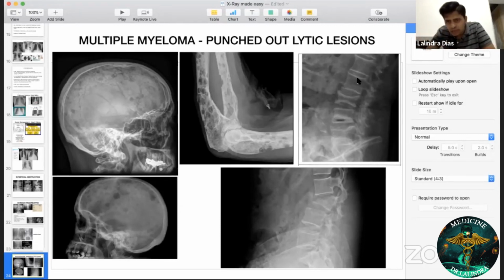Can you see? Only the margins are white. The center is all black. There's osteoporosis. Here, black, white lines, and the center it's very low density. So that means bone is weak. Weak bones are called osteoporosis. So the patient has got severe osteoporosis, and this is a wedge fracture.